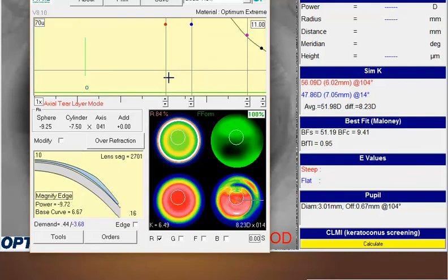So looking at the trial lens data that you used, it had an optical zone of about 7, so that would be appropriate because that would put you right in the outer part of this cone. And so what I did is I did a little mock-up here.